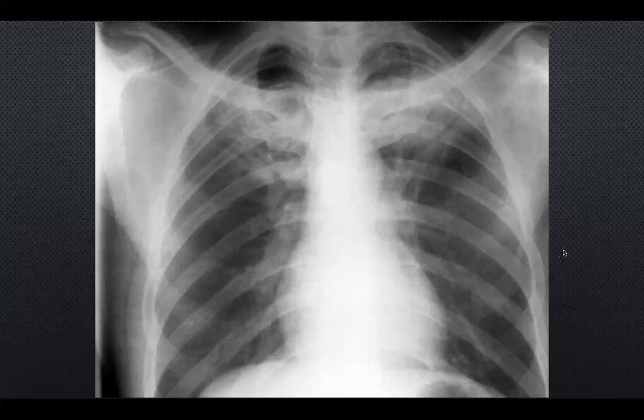So I like the system that you went through, looking at the lung zones, looking at the heart. You mentioned well that the costophrenic angles you cannot see. Obviously, this is not an adequate film. But in terms of the thing that's most obvious is that there are opacities within both apices. And again, if you don't go through the hidden areas, you could easily miss that, because there is so much going on in the apices. You've got your first rib, your clavicles, your manubrium, the big vessels. There's a lot going on up there, and it's easy to miss opacities.